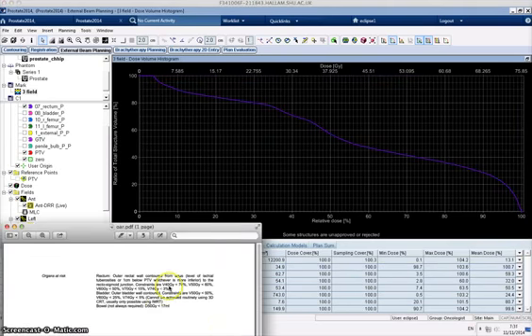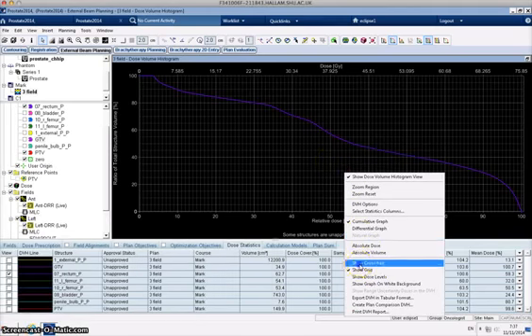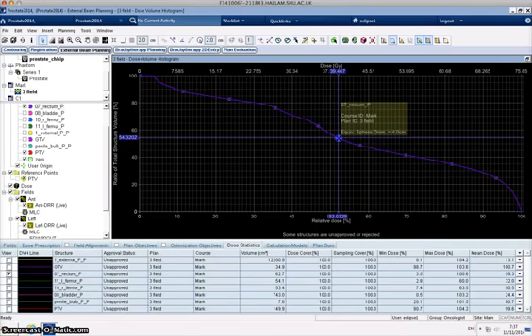So let's have a look at our rectum then. So it says V40 less than 70%. So again, we could roughly eyeball this by going, there's about 40 across there and looking across, and we can see about 50% would be the answer, but that's not very accurate. So as ever with Eclipse, there's a nice little tool that allows us to do that more accurately. So if we right click and show crosshairs, it brings up this little crosshair here, and so we can follow the line by holding down the left mouse, and as we do that we can track along and find 40 grey.